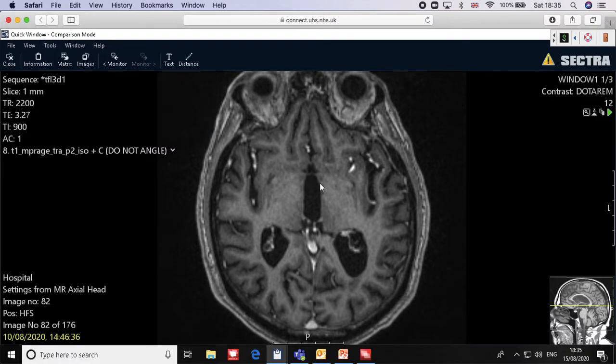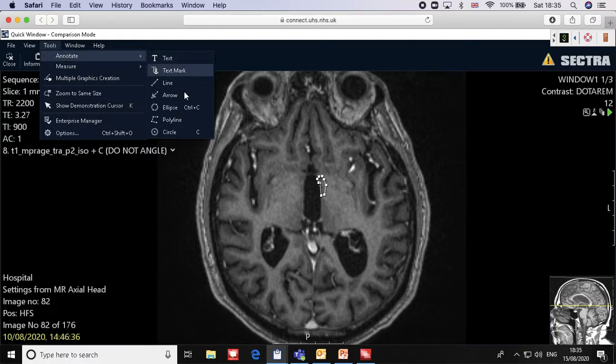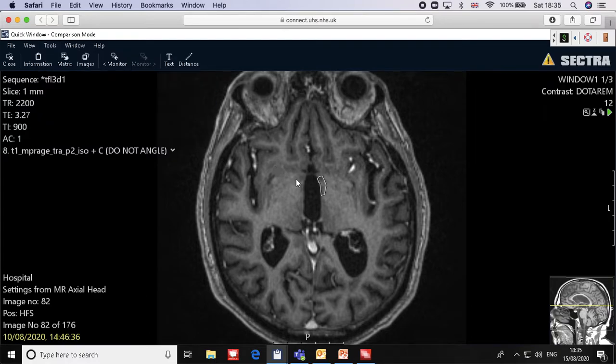You can see it here. I think the MRI is beautiful and it's very easy to delineate it. This is all you have to do. Go to the opposite side and draw another structure of 3 mm thickness.